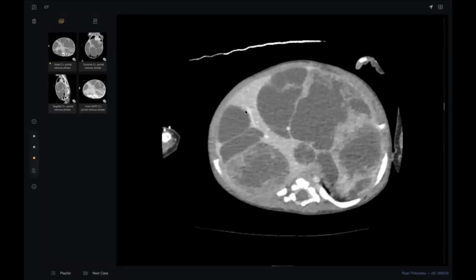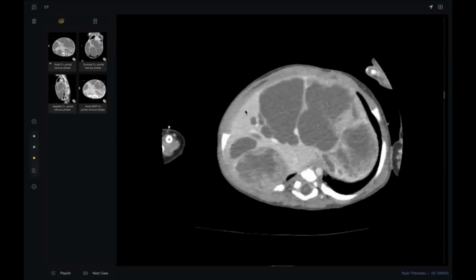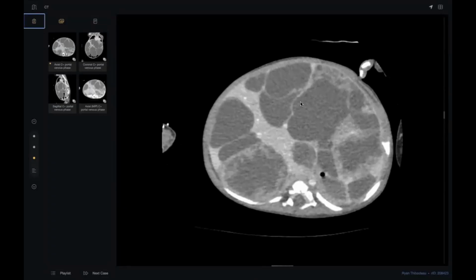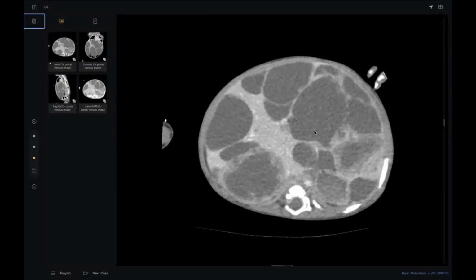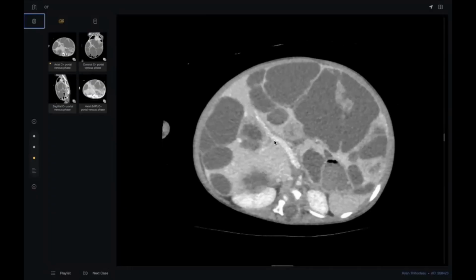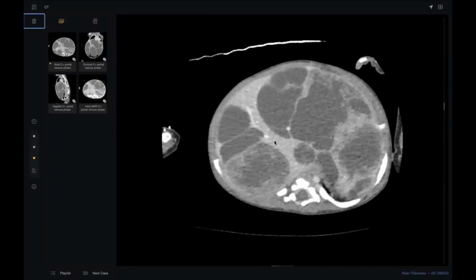This is a case for differential diagnosis. It may be hepatoblastoma or hemangioendothelioma. By the way, this case is hepatoblastoma because the age is very young, 5 years, 5 months. Why? There is no peripheral enhancement or nodular enhancement. Unfortunately, we didn't have arterial or delayed phases to judge the filling pattern, the closing iris sign. This is a mass, by the way.